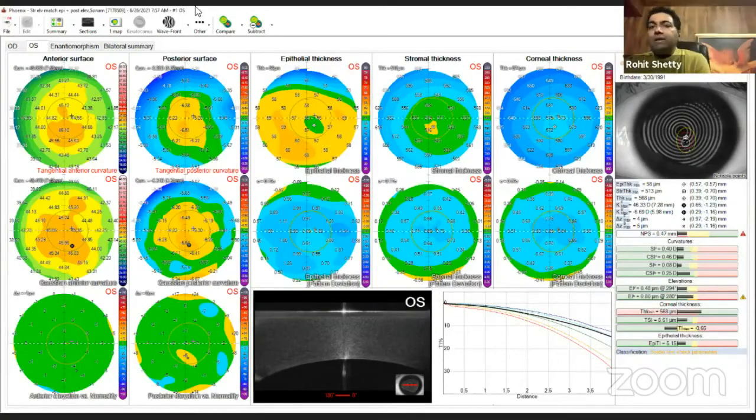Pooja, if you go for any other patient where you have an epithelial map, go for an epithelial map. Let's do some epithelial cylinders, Zernike, because this is a completely new concept. And Dr. Divya and Dr. Chandrasekhar said, if you want to see anything, please let her know, and she would open that particular software, which is your favorite.